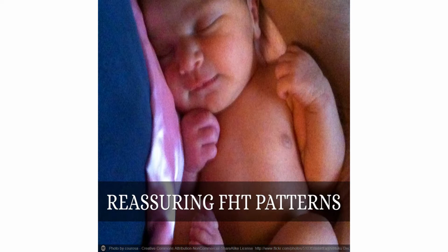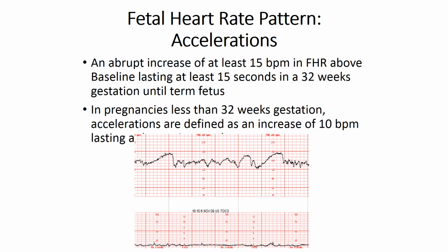So I'd like to talk to you about some reassuring heart patterns. The fetal heart rate pattern accelerations. Accelerations are an abrupt increase of at least 15 beats per minute in a fetal heart rate above baseline, lasting at least 15 seconds in a 32-week gestation until term fetus.